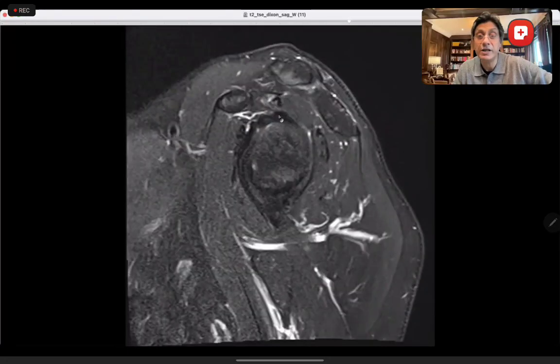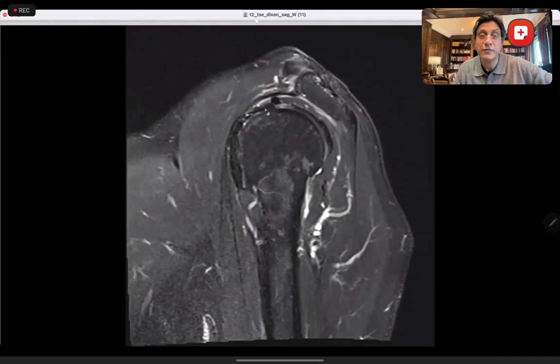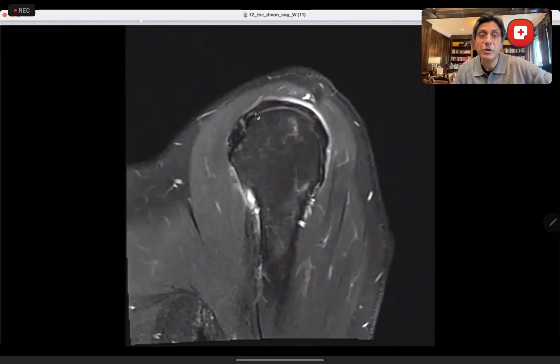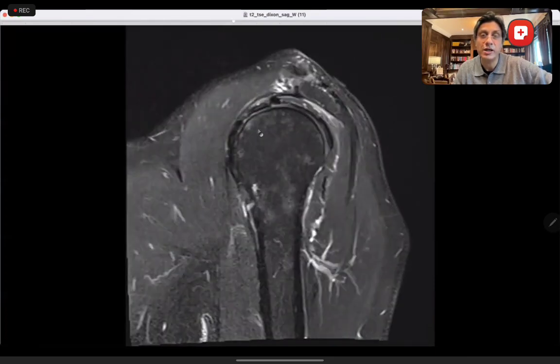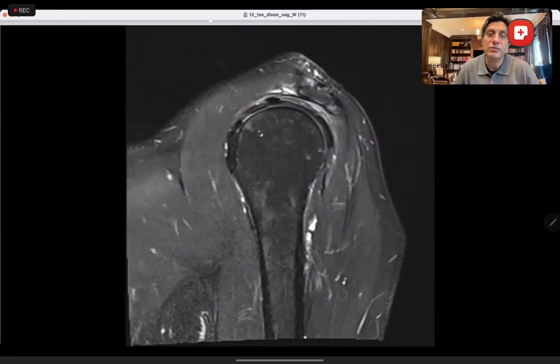Sitting right here. Follow it. Starts here from the glenoid. Just follow it here. Keep going. It's coming out here. There it is. So it's come out. So that's pretty okay. Not much going on. What about the shape of the acromion here now? Which type is it?